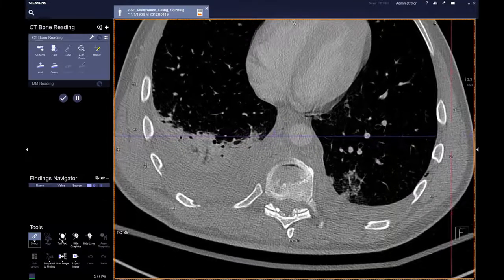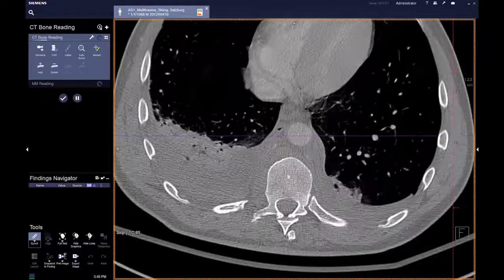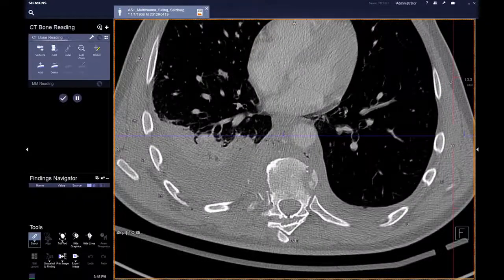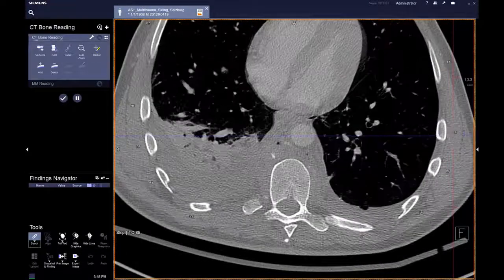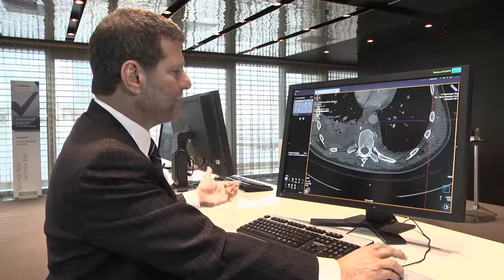You can see that I've got right 9th rib, right 8th rib, right 7th rib, and you say, well, why do I need that? Because I'm constantly losing track of where I am, and when these structures move obliquely, like here, I don't know which piece belongs to which particular rib, and this becomes very, very problematic. What level am I at in terms of those vertebral bodies? Very, very difficult to see.